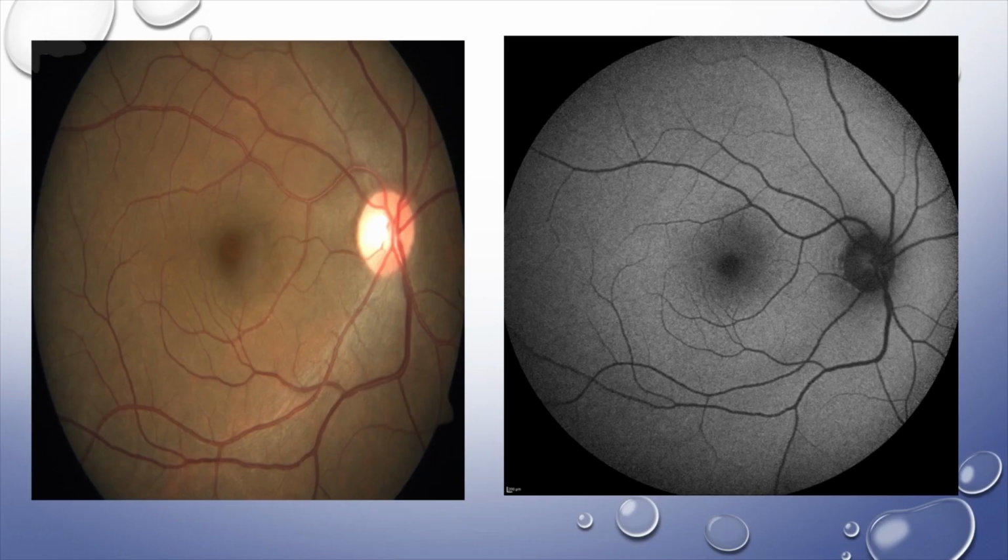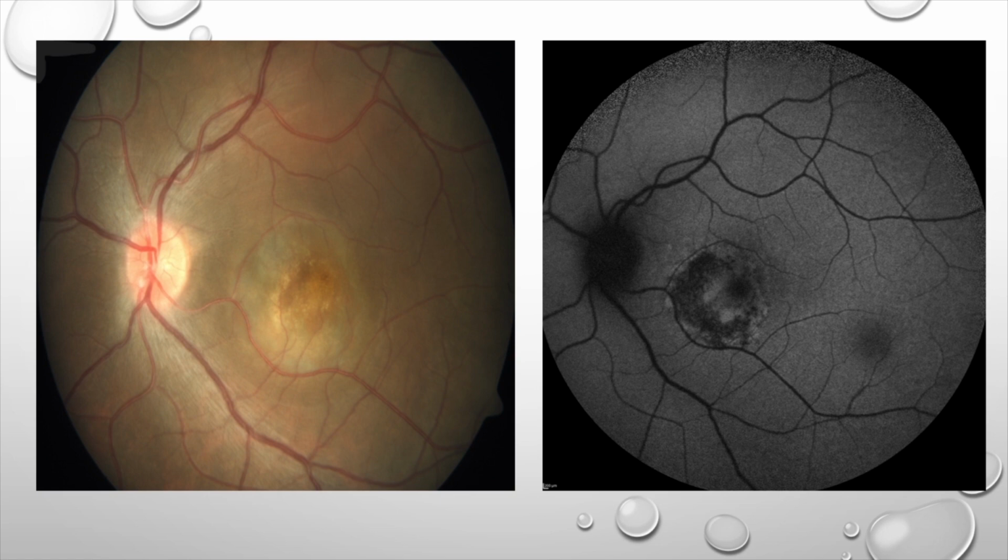This is a fundus photo with the corresponding autofluorescence picture. It is of the right eye. It is unremarkable. Coming to the left eye, can any of the PGs describe the fundus photo? This is a fundus photo of the left eye, which is showing diffuse hypofluorescence with hyperfluorescent borders, which we are seeing on fundus autofluorescence. Color fundus photo, sir. Okay, the picture on the left is the color fundus photo of the left eye with a clear media and a normal cup disc ratio with an AV ratio of 2:3.